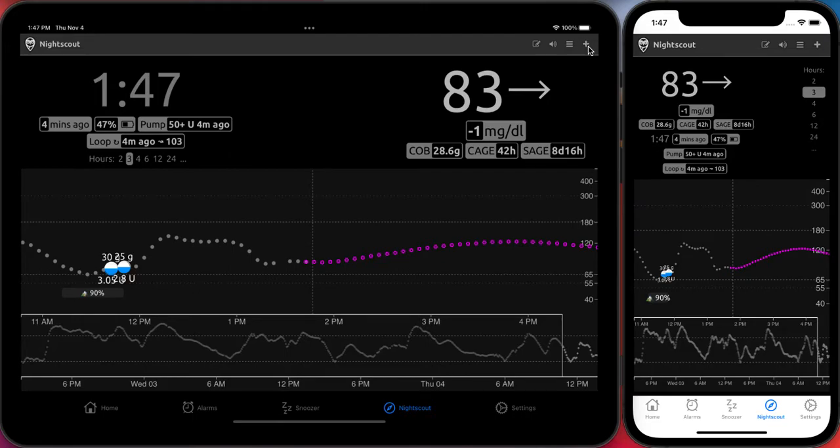So if you have a little lock icon instead of the plus sign here, go ahead and click it. You'll be asked to enter your password. Make sure you click save option underneath the password entry so that you don't have to enter it again.